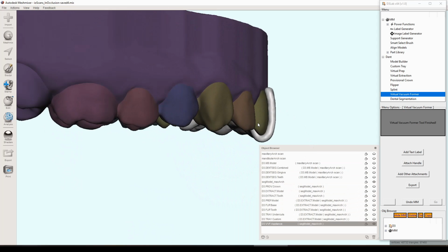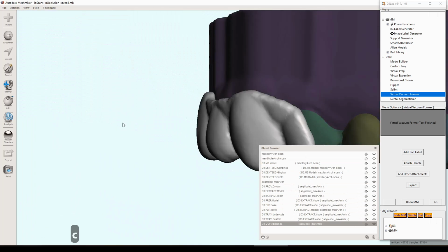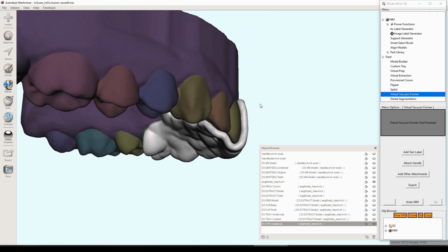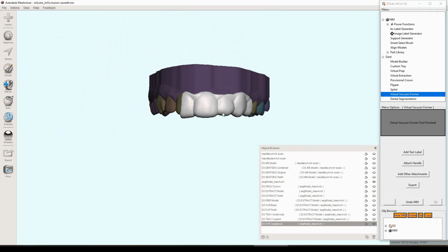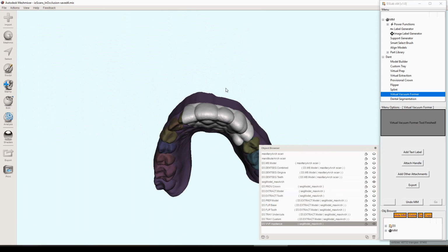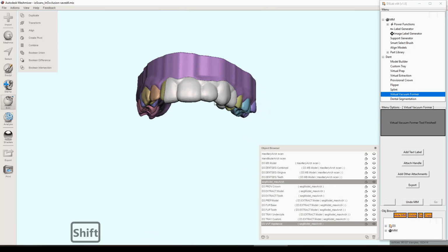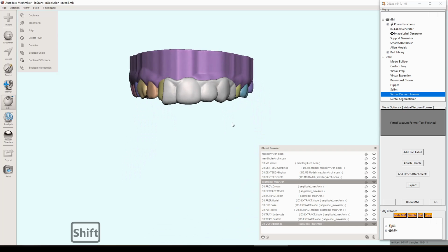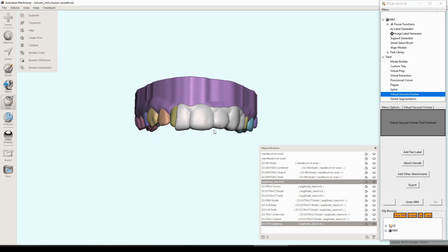And when this prints, it's going to be a really crisp, high resolution print that can be done with the technology of our 3D printers. So these could very well make some exceptionally nice looking provisionals. That's what it looks like on the model there. And you can send that to the 3D printing software and get that ready to print.